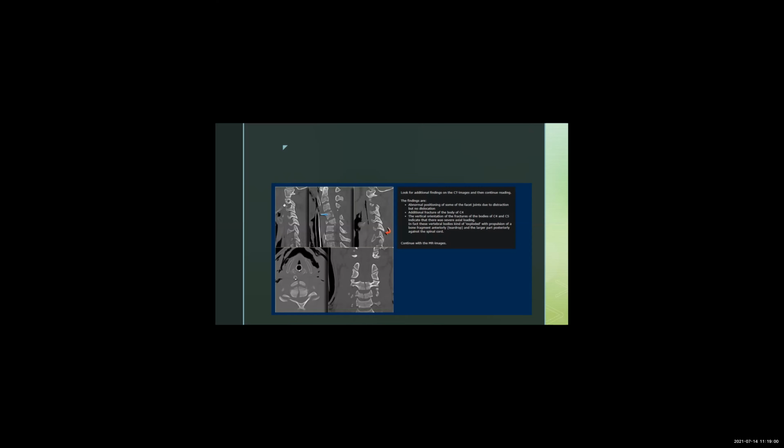We call this view sagittal, it's the lateral view. This is called the axial view. And this view is called the coronal view. Here you can see the fractures right here. One here, this little line through the vertebral body. Here in the axial, you can see it beautifully right here. This is an endotracheal tube, so sometimes people get intubated. They put a tube down their throat, and all this air here, we call this emphysema. So they have air inside their soft tissues. I'm not sure if maybe they had trauma, or maybe they had an intubation, but that's how air looks on a CT.